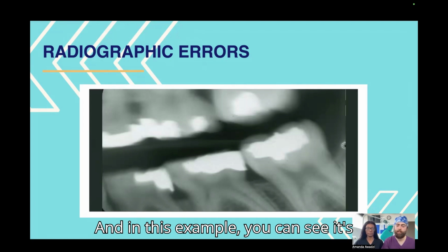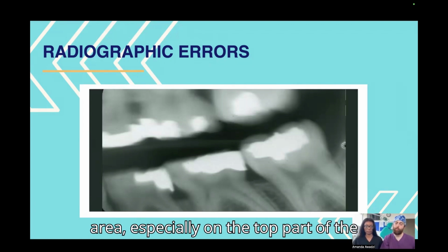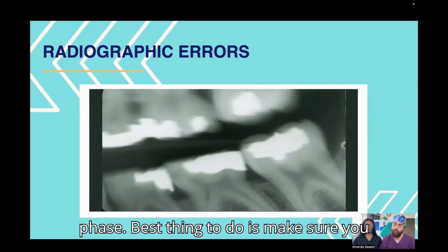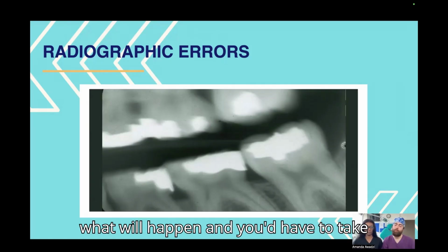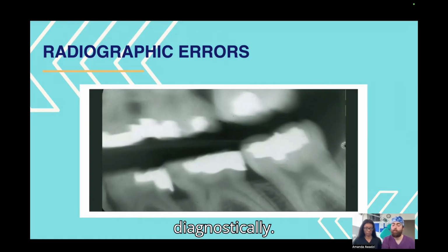Cool. And in this example, you can see there's quite a bit of fogging going on in the area, especially on the top part of the bitewing. This is most likely due to light exposure during the processing phase. The best thing to do is make sure you don't open the X-ray film prematurely and expose it to light, because this is what will happen, and you'd have to take the X-ray again, as it's unacceptable diagnostically.